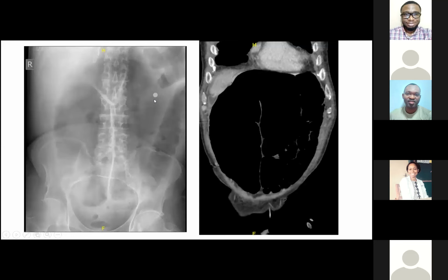And this is the same patient again, slightly different on a different day. Again, you're showing this distension of the sigmoid colon pointing down into the left iliac fossa. There's an equivalent CT scan. What this doesn't show you is the actual twisting of the mesentery, but this is a classical case of sigmoid volvulus. And you can use plain films following insertion of a rectal flatus tube to track the progress and see how the patient has responded following the decompression.